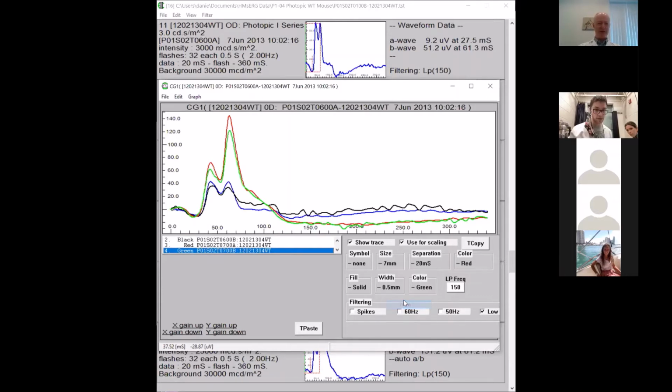We can make it a 6mm line if we'd like, make it fatter. We can use different symbols to highlight the different waveforms if we like. So there's a whole variety of ways to take the data, after you've done your comparison, and set it up the way you want to use it as evidence or for your experimentation assessment.